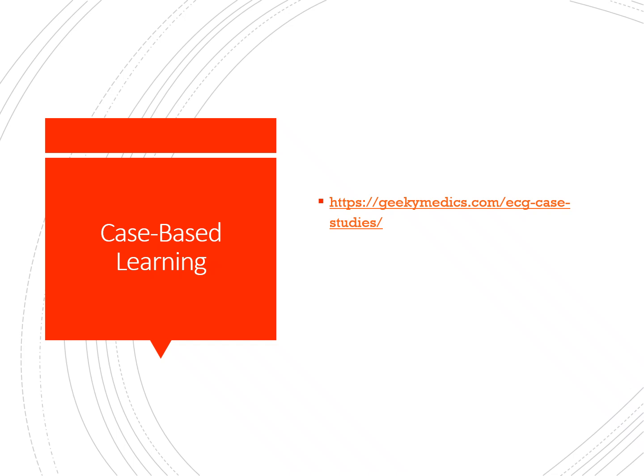Now that we've finished our side-by-side rhythm strip comparison, we're going to do our case-based learning, and we're going to look at real rhythm strips from real patients. Each case study includes a patient presentation and then an EKG strip to follow. So let's pull up the website here.